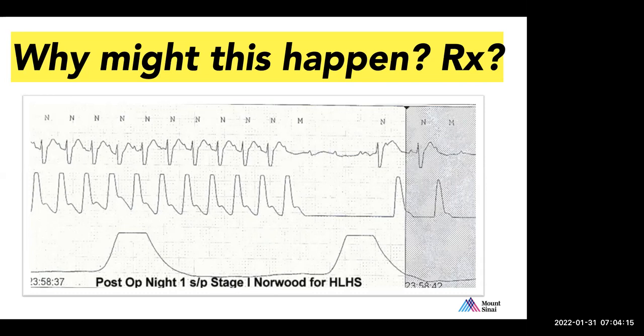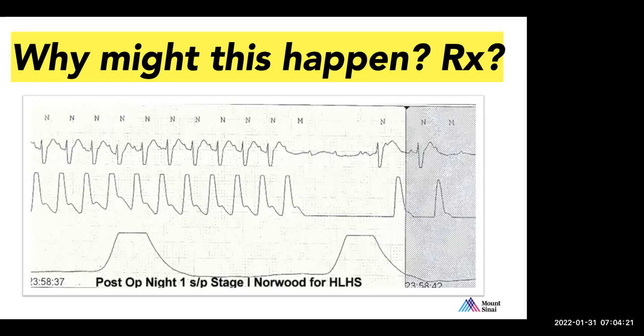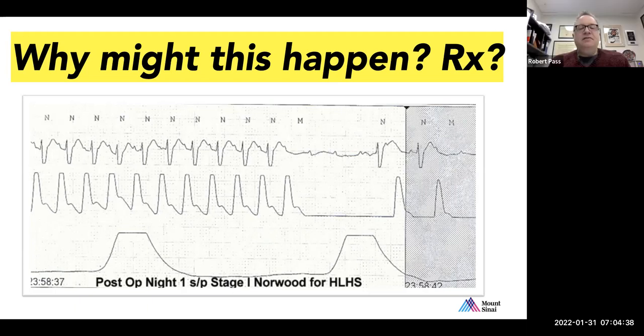So the question why it happens, I don't know. But this is some kind of heart block, right? Yes. So is it first degree heart block? No, it's not, because in first degree, we see just a very long PR interval, but every P wave is conducted, usually reflecting either AV nodal or Purkinje disease, usually AV nodal.